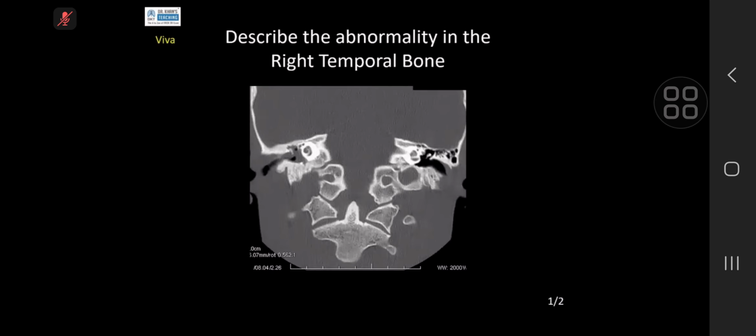Okay. There is opacification of the middle ear air space. I could not appreciate the ossicles as I can see them on the left side. There is erosion of the scutum. It looks like the tegmen tympani, which is the superolateral part, is slightly sclerotic compared to the left side.